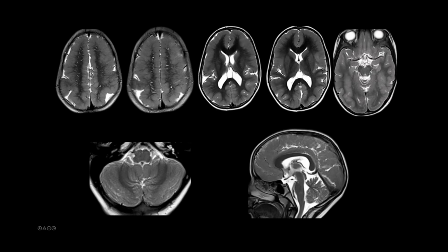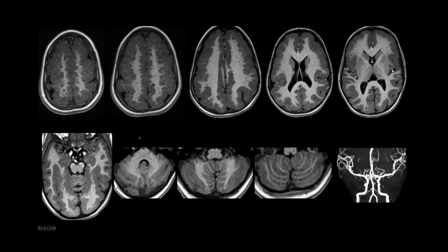In the zoomed in images of the posterior fossa, you can appreciate these tiny microcerebellar cysts, especially on the right cerebellar hemisphere. The corpus callosum is dysplastic. The brainstem is also abnormal and hypoplastic. The vermis also is abnormal. Thin slice T1 weighted images, again, you can appreciate the extensively malformed cortex and also the subcortical cystic changes. In the cerebellum, these are actually subcortical subpial cysts. I think one of the registrars should attempt the diagnosis and see what the differences are.